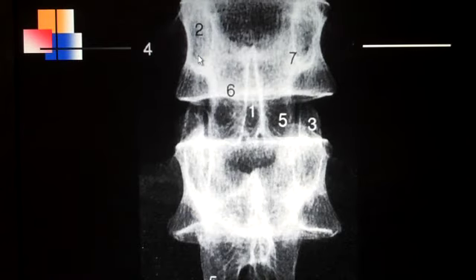Number two is labeling the pedicle, and the pedicle is all of this circle right here. The pedicle is all of this, and on this side we would be all of this. Number three, the superior articular process. Superior goes up to here, comes down right there. All of that is the superior articular process. And so you see the joint space right here at the point of the arrow. That's the joint space called the apophyseal joint.